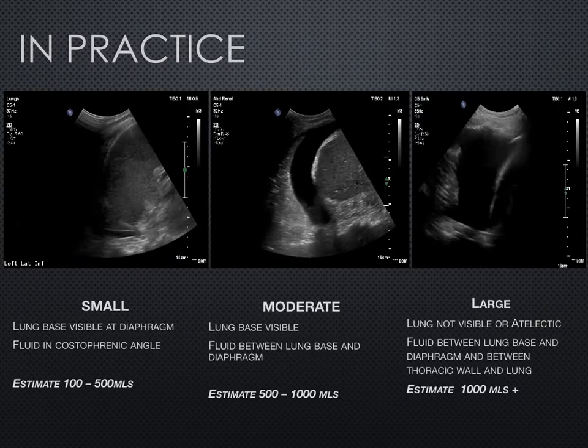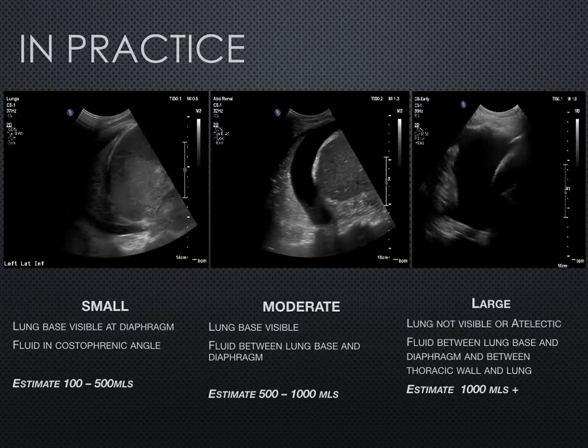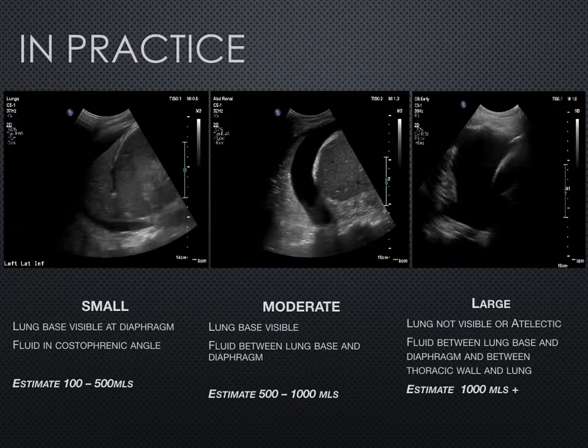For larger size effusions, you would most definitely not be able to visualize the lung in any real terms, or if you are visualizing it, it's going to be atelectatic, so it's going to be compressed by the level of fluid within that thoracic cavity. And this would definitely be worth draining, because there's going to be over a liter at that time. Like I said, the more pleural effusions you see, the more you're able to interpret the size of those effusions.